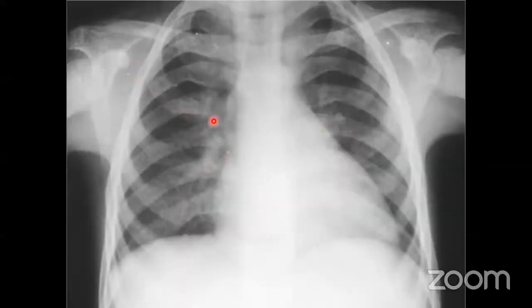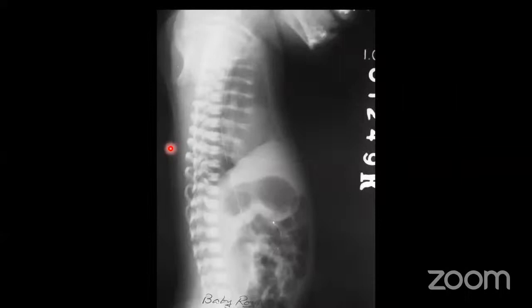Here in this X-ray, you can see the cardiac silhouette is enlarged, and there is some undermineralization of the visualized vertebra. So it must be a case of chronic hemolytic anemia, and this anemia has produced the enlarged heart shadow. So most probably this is a child with chronic hemolytic anemia. And here you see the ribs are falling short of the sternum. So it is a short rib. It is seen in achondroplasia, asphyxiating thoracic dystrophy, and even in Ellis-van Creveld syndrome.